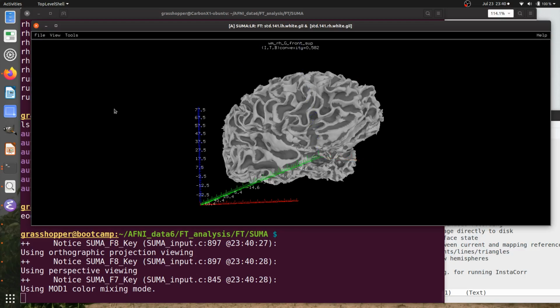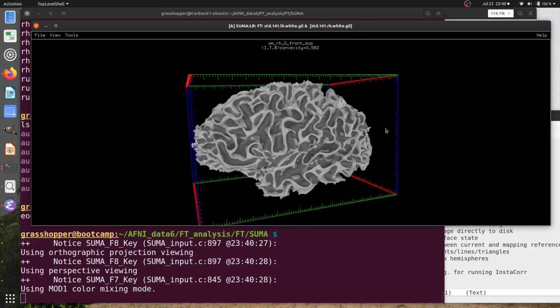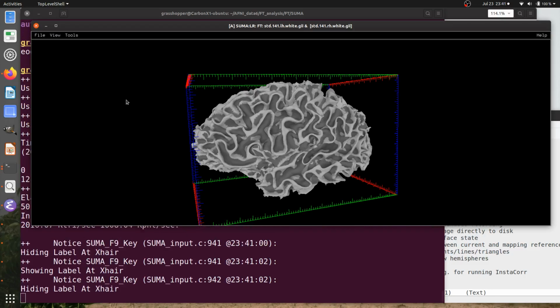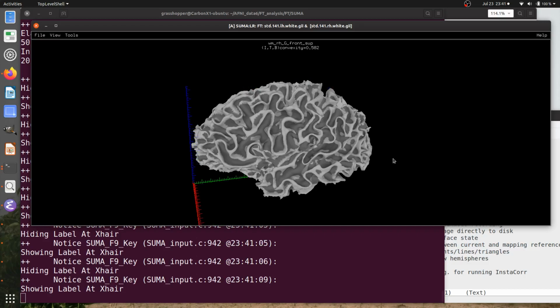You can turn on a separate grid with units and things like this. If you keep hitting F2, you move through this list of different styles of grid patterns, and this can be nice to show the directionality in there. There, it was F9 all along. I thought I hit F9, but there, this turns the text on and off if you want. So hiding the label. Okay. And let me turn off this. Okay, so this was F2.